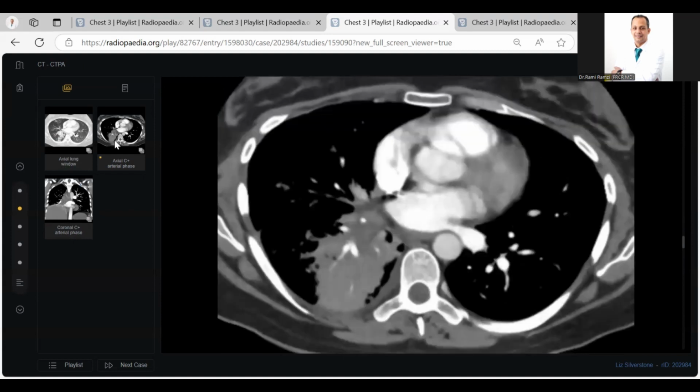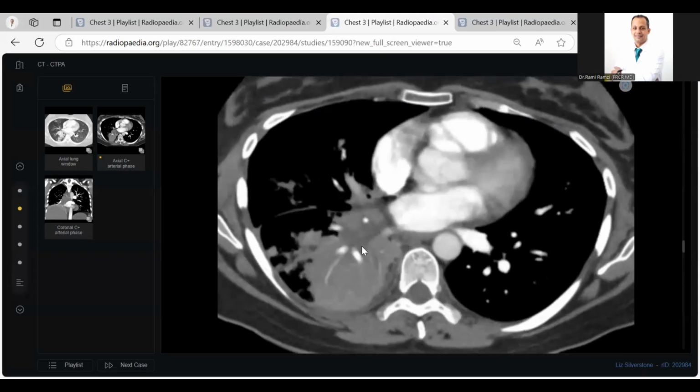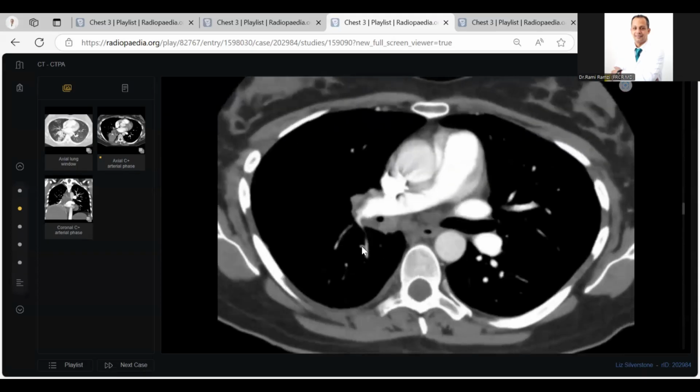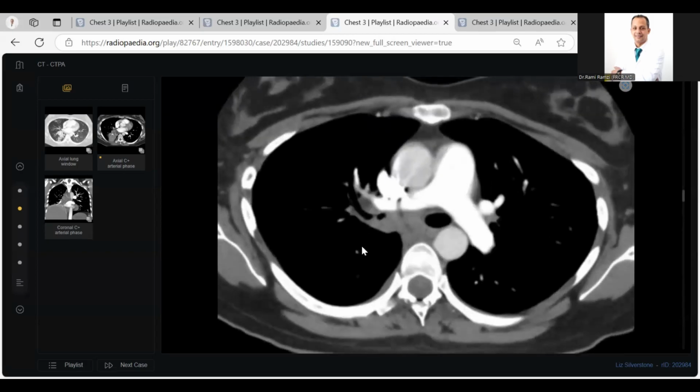I want to see the... Okay, so probably this has caused obstruction of the right lower lobe bronchus, and this is also encasing the pulmonary artery, the right lower lobe pulmonary artery, and there is narrowing of the... yes. This right main bronchus is also narrowed, I suspect.